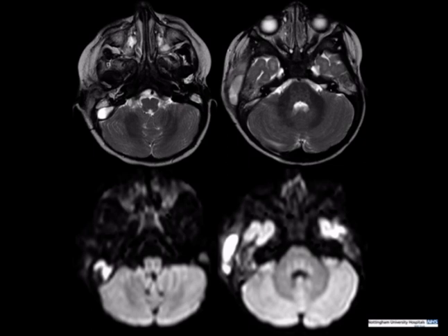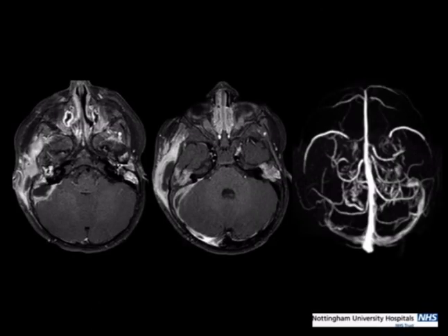So the way to sort that out is to try and follow the anatomy a bit more closely. So here's the infection, all centered around the mastoid air cells with the extracranial component and the intracranial component. This is actually outside the dura, so between the bone and the dura, so it's extradural empyema, as it were.